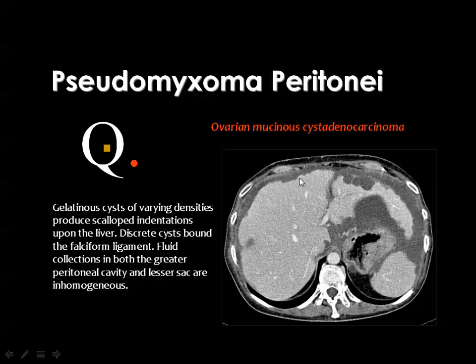And this is one like this one, but with partial volume averaging. It is on the surface of the liver as well.